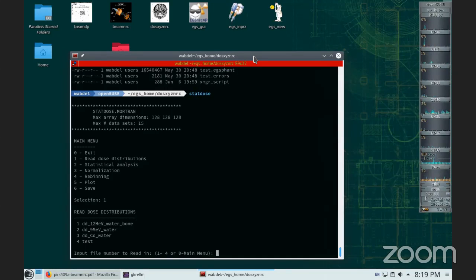The developers of EGSnrc actually made a very nice tool to build such an accelerator. The first thing you need to do is to think of the different regions in the accelerator. For example, we have a photon beam. The first thing we're going to have is a target. We can represent a target by a disk. A disk is enough. But after the target, we have the primary collimator. We cannot use a disk to represent a primary collimator. We need something else.